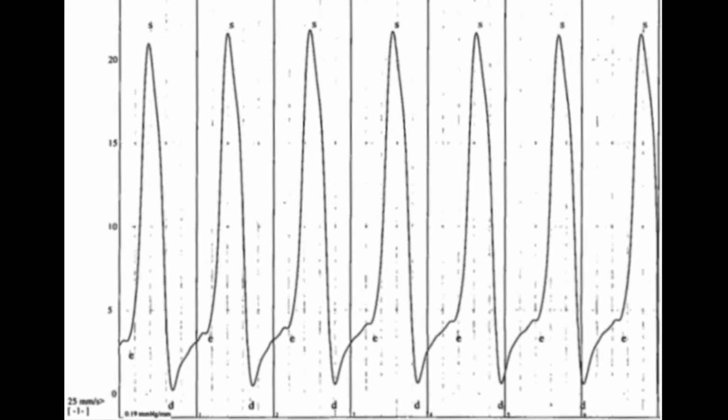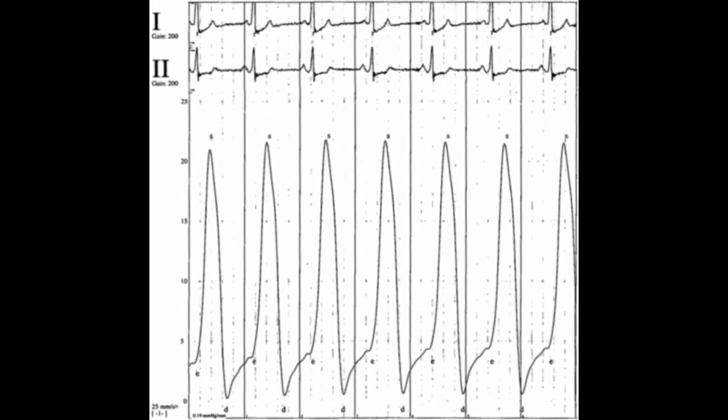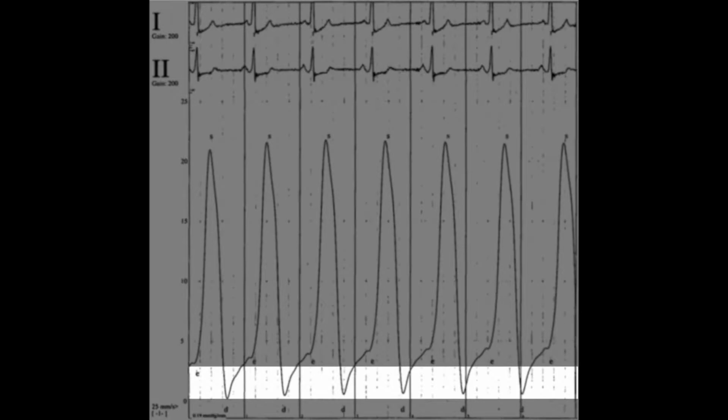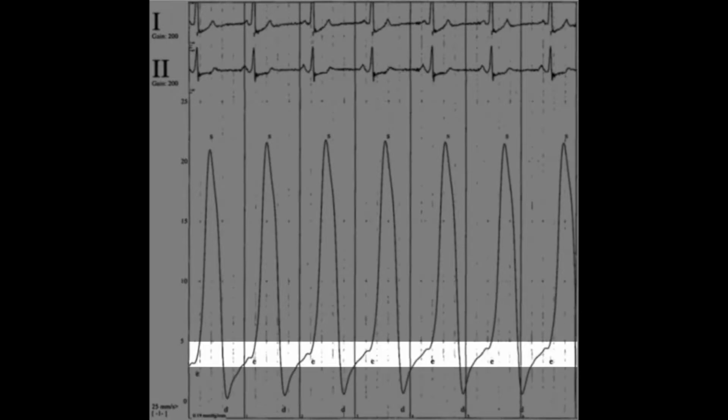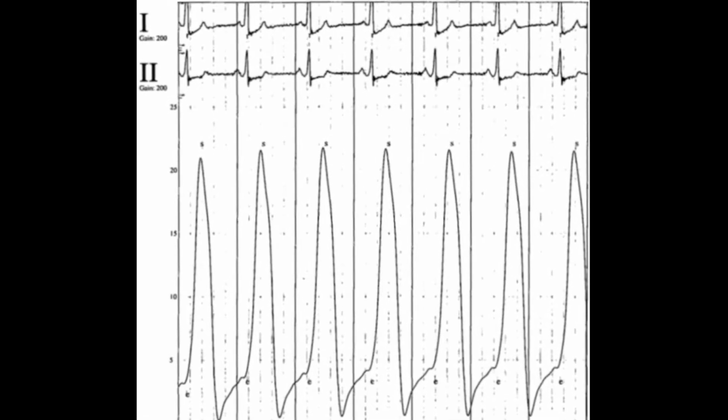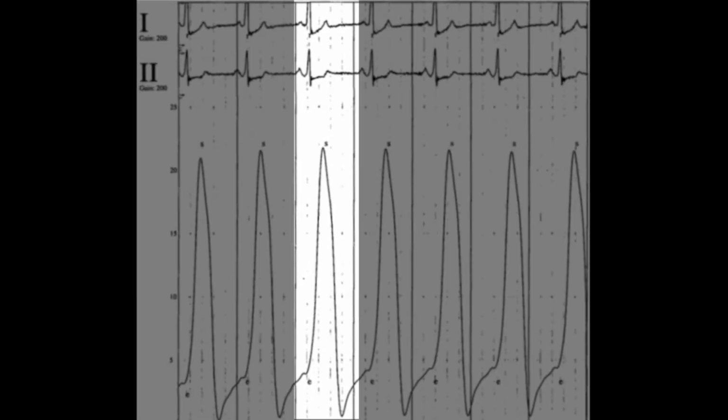Qualitative assessment of the ventricular waveform includes commenting on the relative slope of the upstroke and downstroke associated with the systolic, early diastolic, and end diastolic values. Ventricular tracings can be distinguished by the presence of a single waveform for each QRS complex.